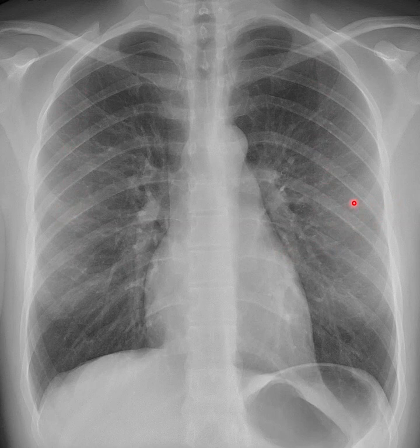So what we'll do is ask our patient to roll their shoulders forward if they can, and then that will bring the scapula out laterally away from the lung field as much as we can get it out of the lung field. So that's one thing I would say that you would want to see better on this image maybe. But I wasn't there. We don't know the patient's condition, right?